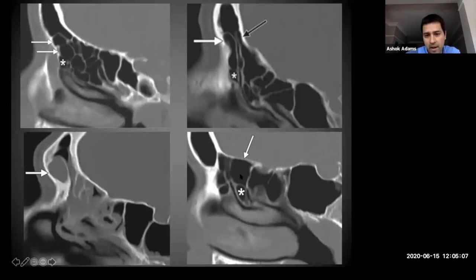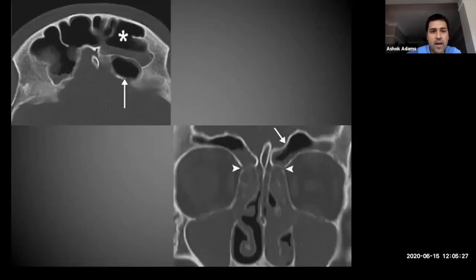Then we'll go posteriorly in terms of the posterior frontal ethmoidal air cells. Again, here you've got the ethmoidal bulla, and we'll typically comment if they are suprabullar. You can see here the suprabulla, and here this frontal bulla air cell, which is adding to potential compromise in this patient in terms of the frontal sinus drainage pathway. I don't typically put in a lot of anatomical variants. I suspect our sinus surgeons are much better than I am. There are a few variants I will comment on.